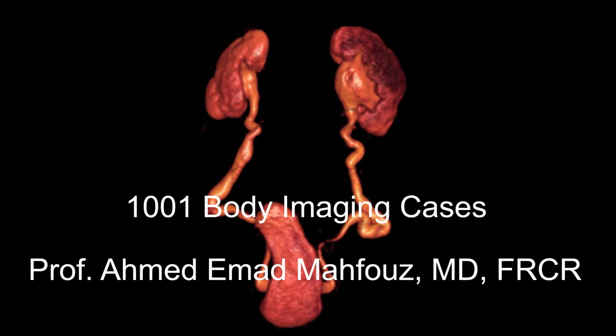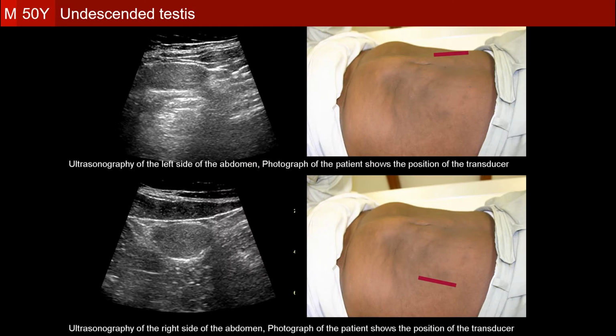Welcome to the body imaging cases. A 50-year-old man with bilateral undescended testicles, which were identified intra-abdominally on this ultrasonography.